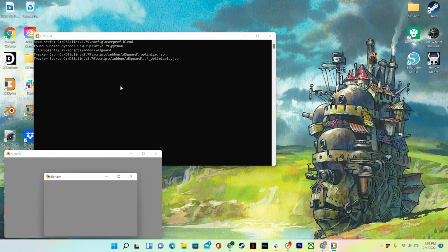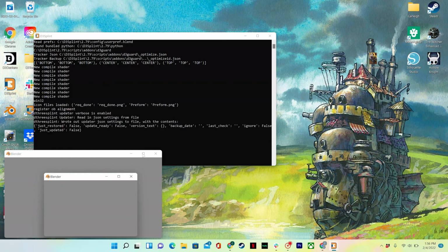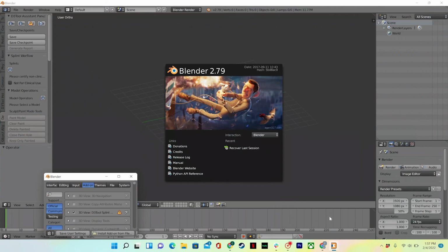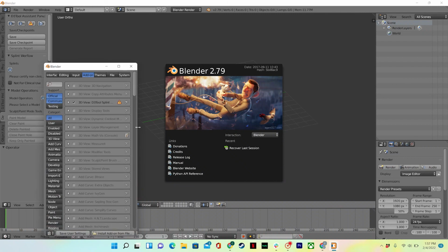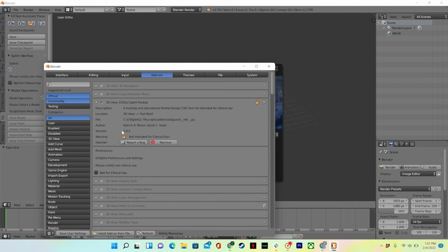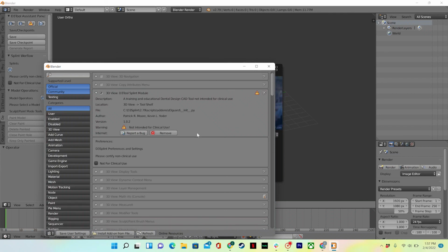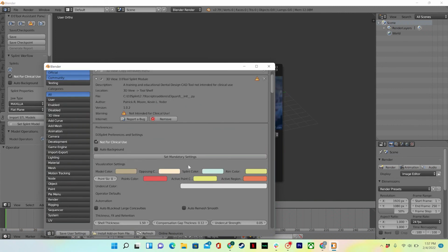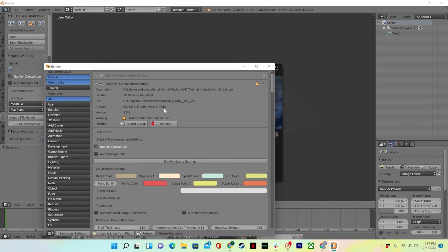I will relaunch D3Splint. And now you'll see I'm running 1.0.2. And after that, you should be good to go.